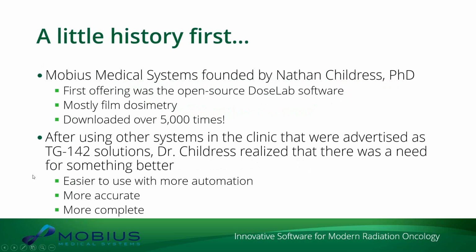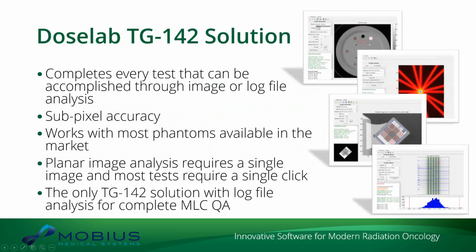It seemed that the different products out there had pieces of what you could do for TG-142, but not all of it. So he wanted something a little more complete. He developed the DoseLab TG-142 solution, and this solution will allow you to complete pretty much every test that TG-142 recommends. That can be done using an image of either a phantom or an open image, or a log file.